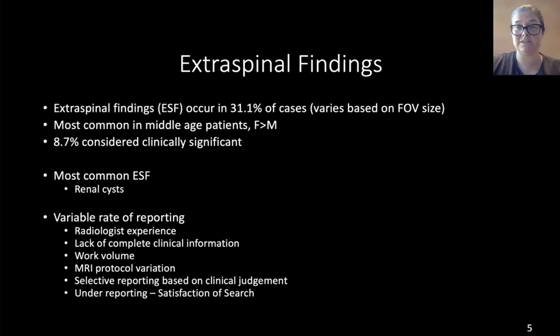So this is just another pitch to look at things outside the spine. Extraspinal findings occur in about 30% of cases. Most of the time it's stuff that doesn't really matter, like little renal cysts, maybe even little hepatic cysts, but occasionally you will find very significant things.